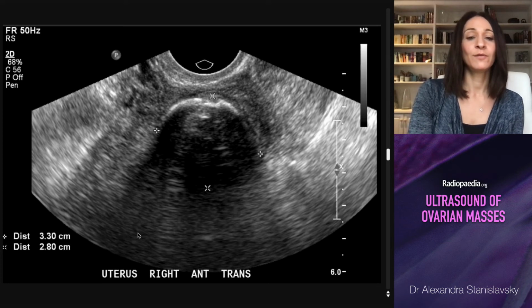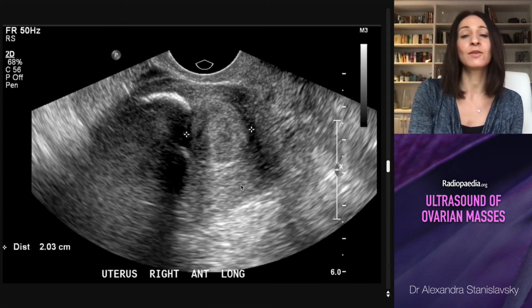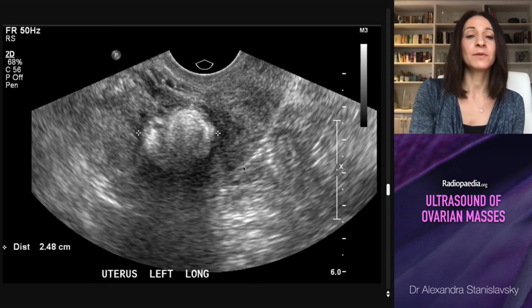Okay, so before we start diagnosing this area, please note that this is actually uterus, so we're still looking at uterus pictures, but we've got a mass with calcification and acoustic shadowing, and then we've got another one here. So we're actually starting off by looking at a multifibroid uterus. There's another appearance, and there's another fibroid which is echogenic.